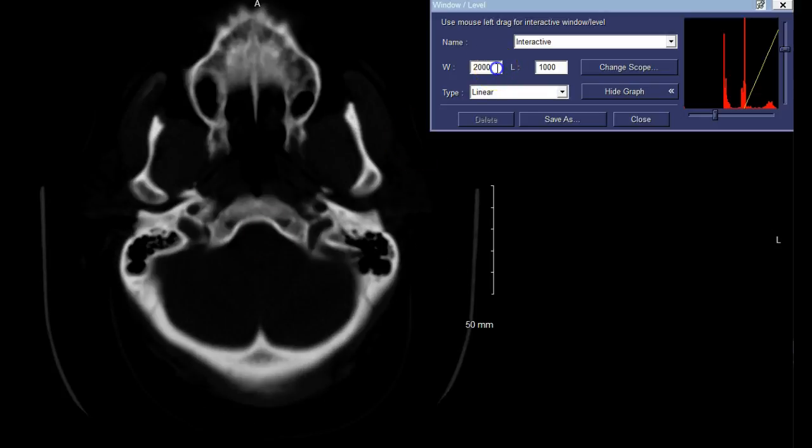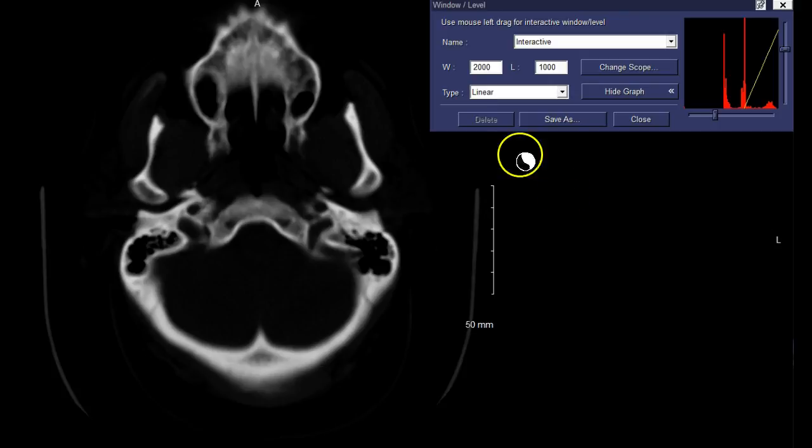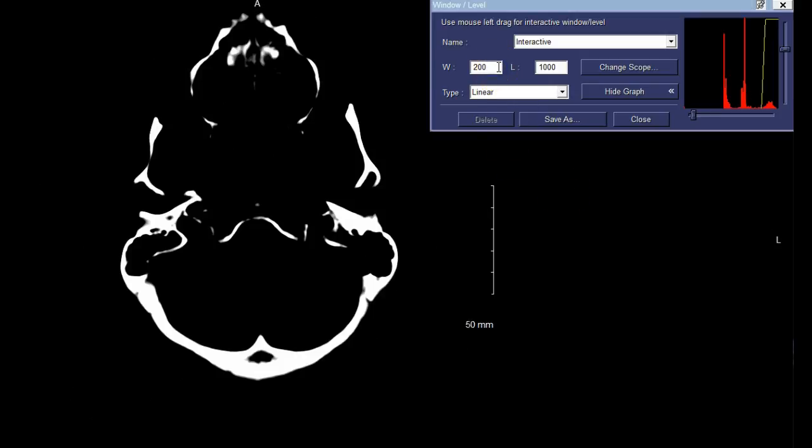What happens then if we say, all right, I want fewer grays? What's that going to be able to visualize? So we go through fewer grays. Oh my gosh, now it's very contrasty. We're not able to visualize really anything. If we want even fewer grays, now look at that. We went from 200 to 20, even less.